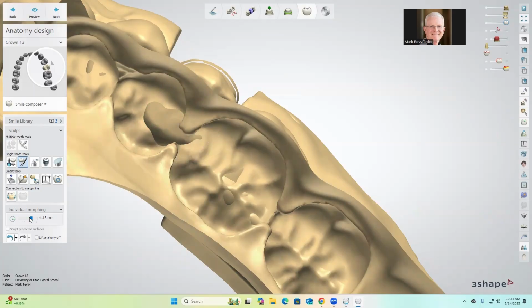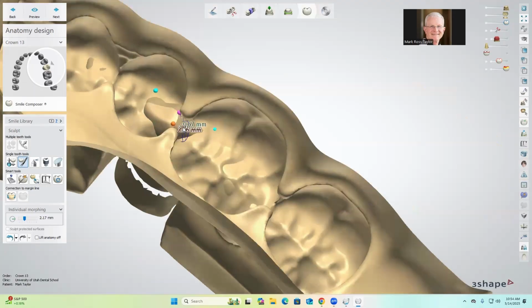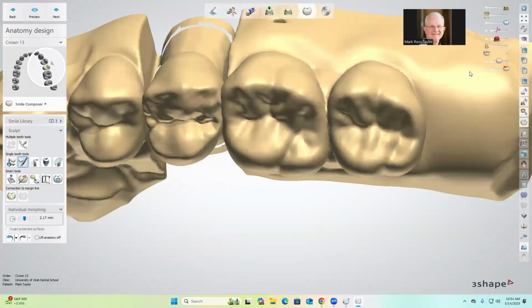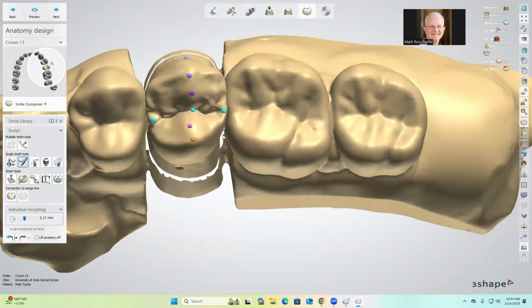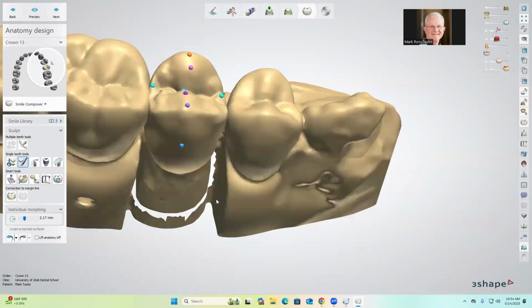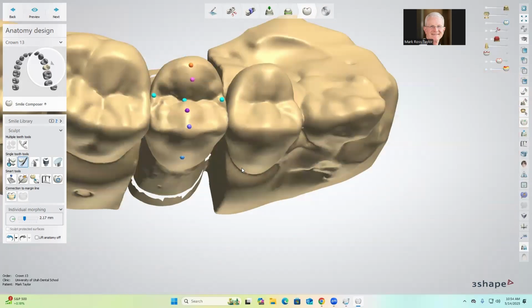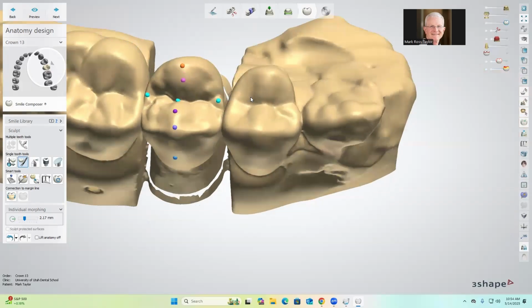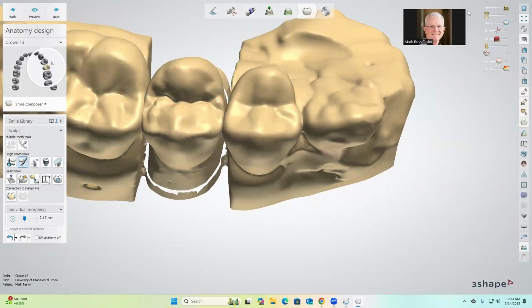So I can make that a little bit smaller, and I can come back over here and just change that grooving right in here. Now I can get rid of that. Now I know my position's correct. Does it look right? No, this is too flat, this is too round. I can come in here, move that, and move that more around in that position. So now I have what I'm looking for, just general shape. It's not perfect, it's not exactly what I want in this position.